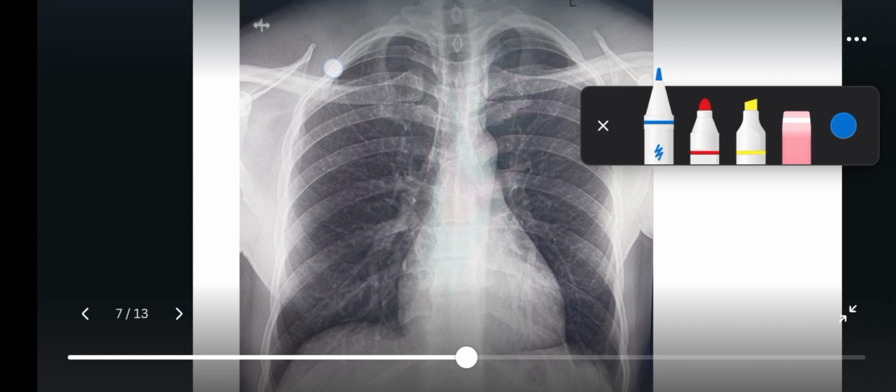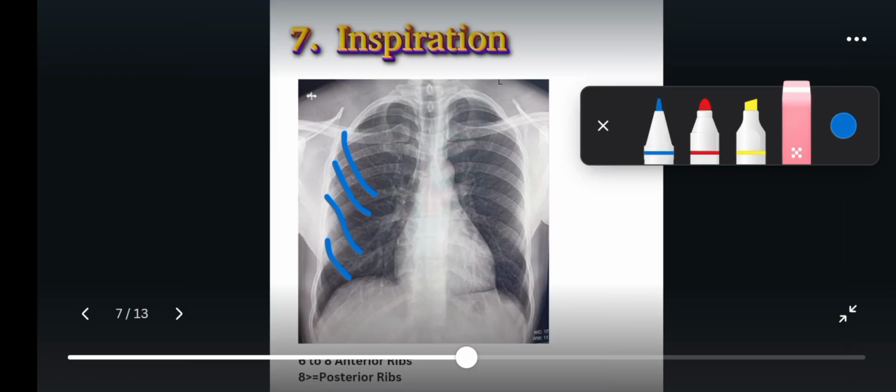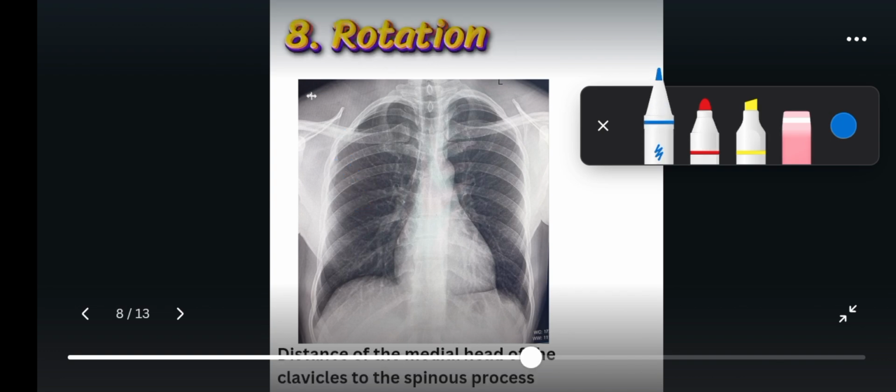This is the first, the second one, the third one, the fourth one, the fifth one, the sixth one. This is the seventh one here, this eighth one here. But we can only take this sixth one. The last rib we will accept has to be the one that cuts at least the midpoint of the diaphragm. This is the diaphragm, so it has to cut at the midpoint of the diaphragm.